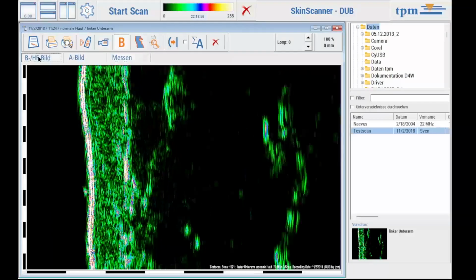To extend or correct your data about the patient, this paper sheet-like icon is the right thing to do. A click on it opens a window. There you have the possibility to enter the examination data and to read the recording data exactly, but you cannot change them. You can add other image recordings, for example via the Firefly camera, or also histological images.